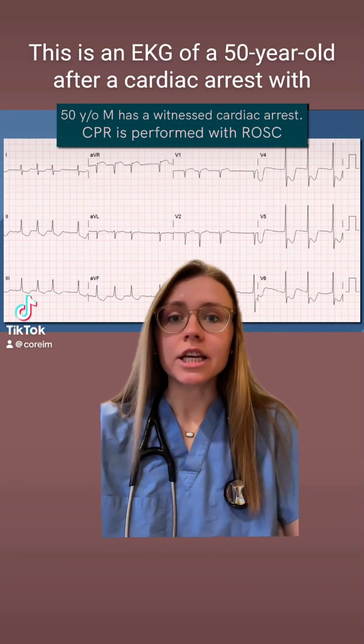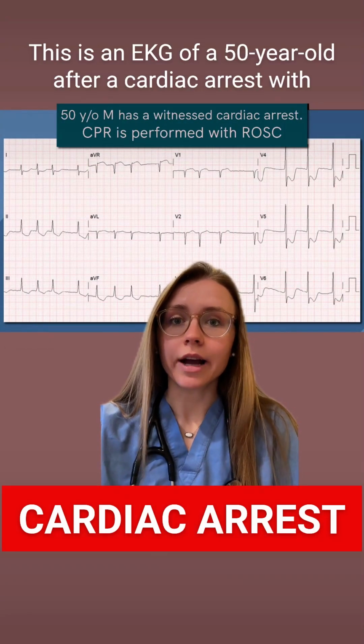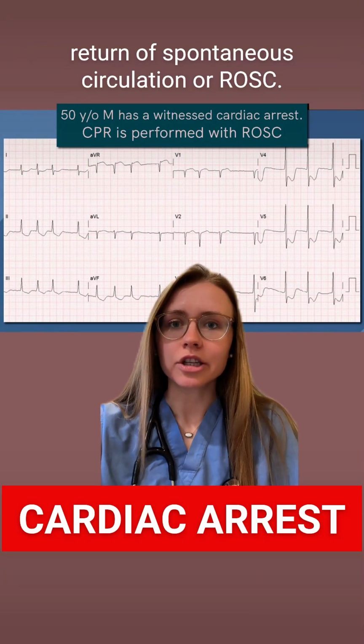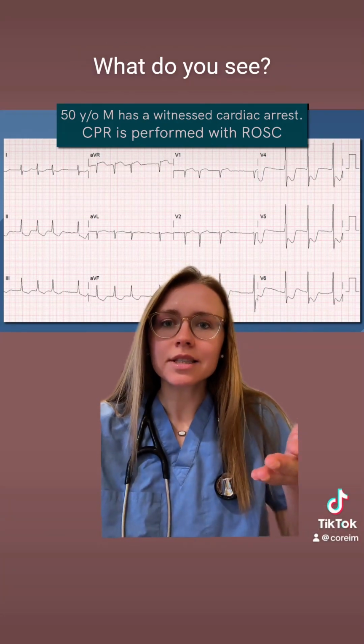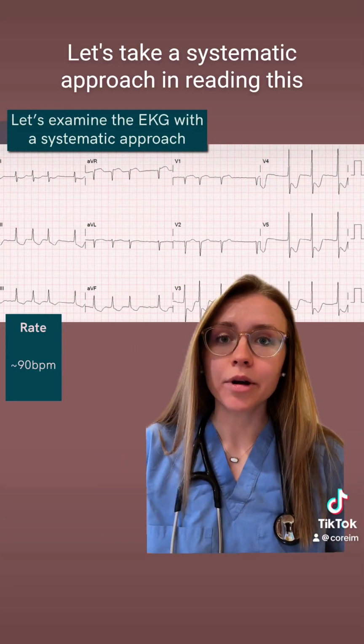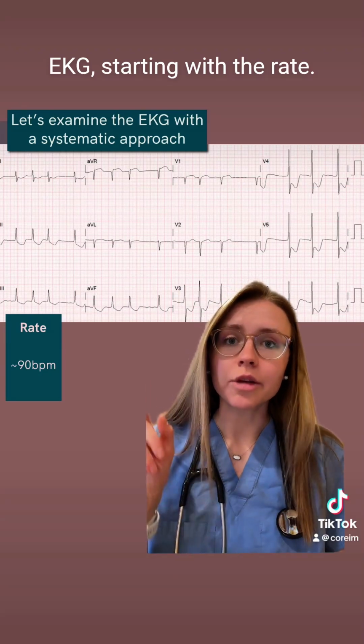This is an EKG of a 50-year-old after a cardiac arrest with return of spontaneous circulation, or ROSC. Let's learn to read this like a cardiologist. What do you see? Okay, let's take a systematic approach in reading this EKG, starting with the rate.